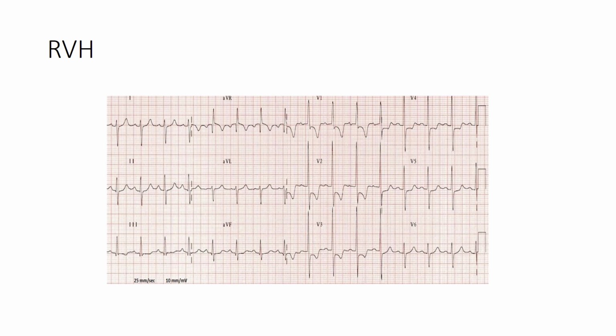Shown here is the ECG of right ventricular hypertrophy. You can see that in lead V1 the R wave spans almost 11 mm, and there is prominent almost 7 mm depth S wave in lead V6, as well as there are associated ST segment depression and T wave inversion in lead V1 to V4, also termed as right ventricular strain pattern.